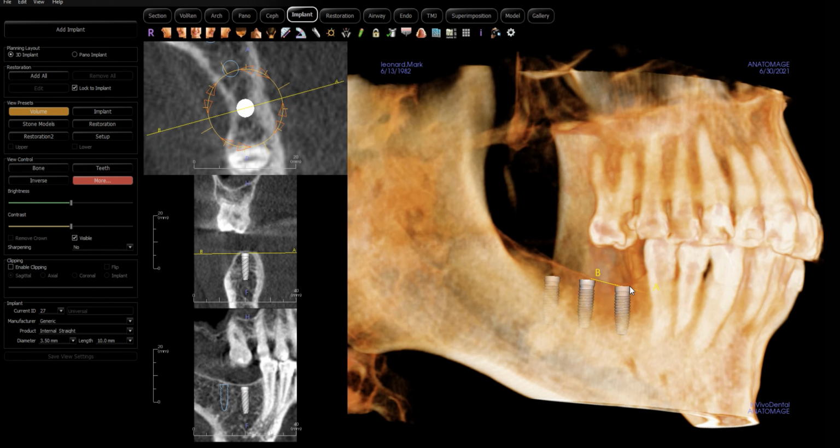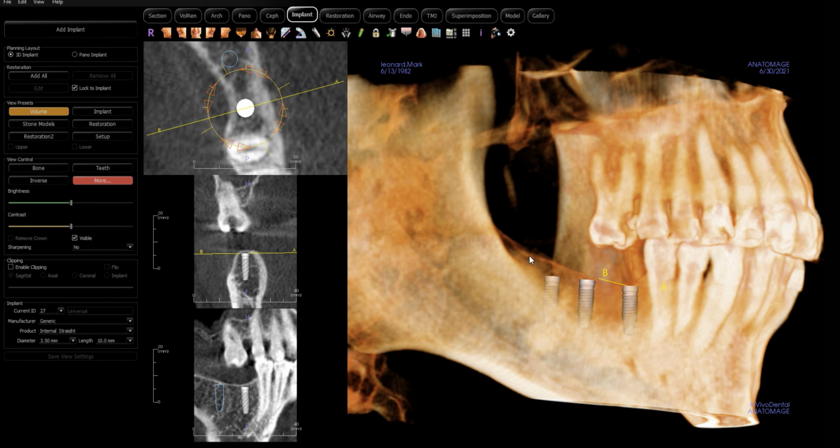So you can imagine that when the crown starts at the platform of the implant, the farther it has to go in a mesial distal direction, the more exaggerated that area needs to be so that we close the contact point. So we don't want to go too far away because that creates prosthetic challenges that also increase the risk of food impaction underneath. So where we place this particular implant is important. 2 to 3 millimeters would be perfect. All right, so something like that.